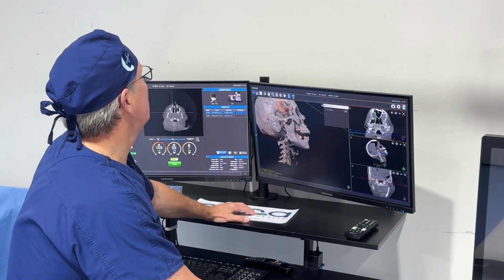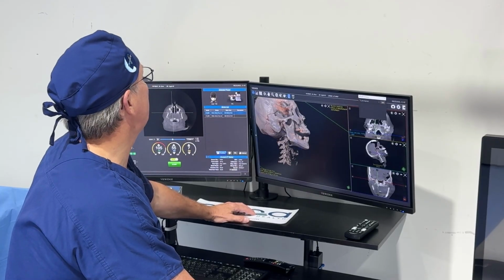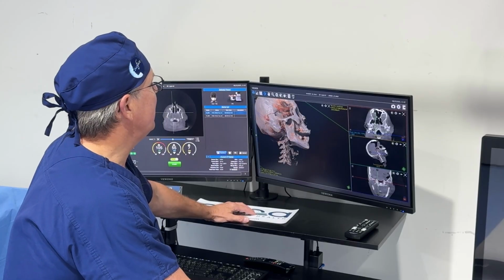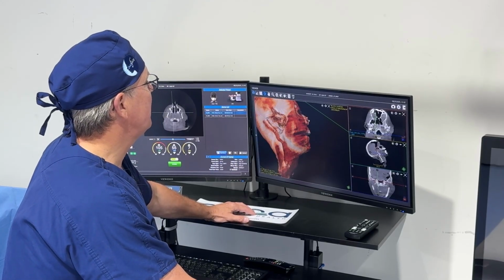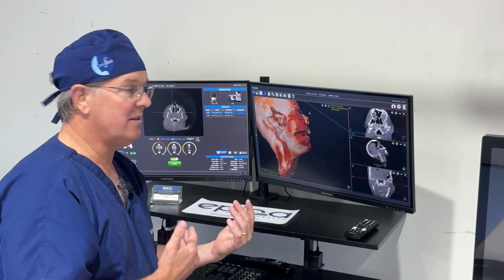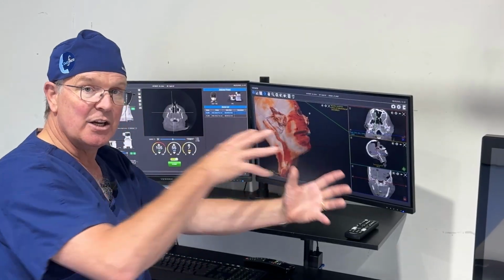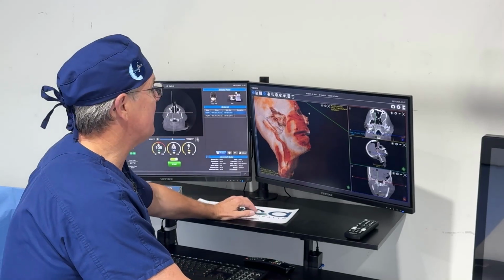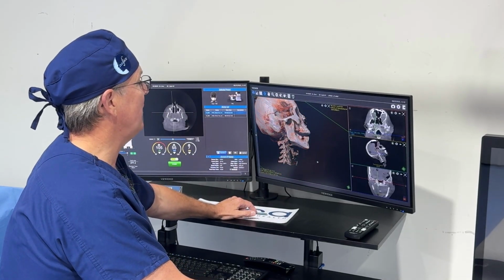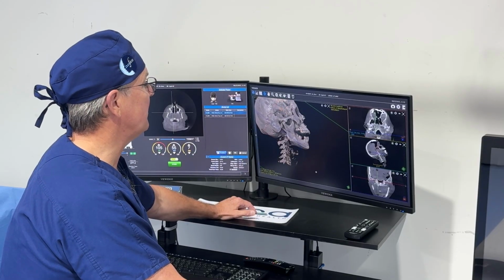And so what it has the capability of doing is bringing in the soft tissue. And you can see here is the soft tissue that you would be seeing on the CT scan. And then we can subtract it away as simply as this, so that we can focus on the bony anatomy, and you can see it just melt away, and it's so beautiful, it's so clean.